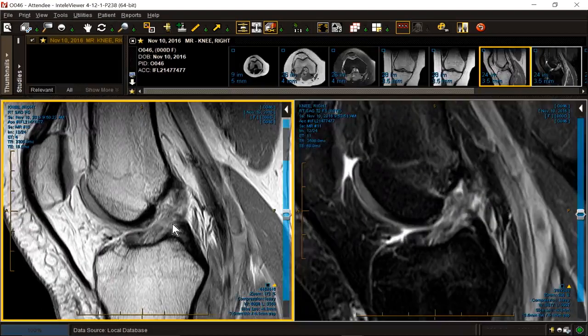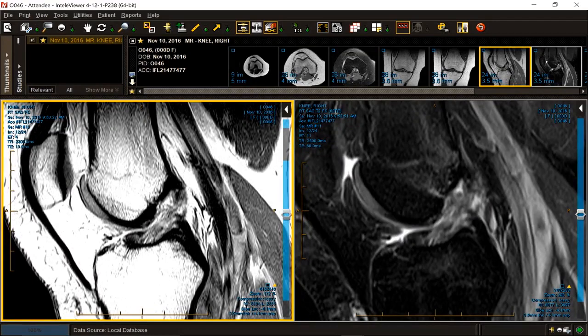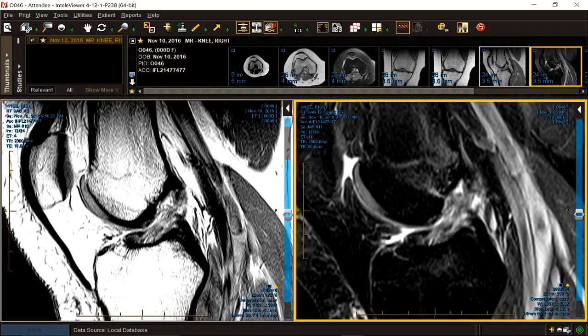But if you really examine the fibers and you really window it down, right there, do they really look contiguous? And when you really examine these fibers, and you've seen some normal ACLs now, it should look like celery, right? Parallel. That's not parallel. That's not parallel. That's not contiguous. That's a piece of shredded, bitten celery.